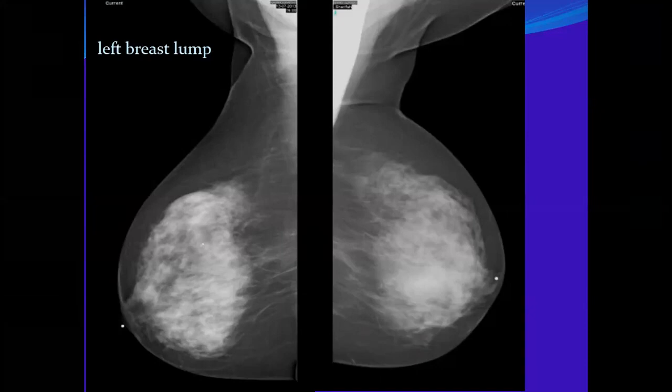I'll say there is suggestion of focal asymmetry. I'll try to correlate if it is the same location of the patient's palpable abnormality or not. Might be yes, might be not. I might say no obvious calcification, but I cannot confidently say there is none. I cannot exclude everything based on this suboptimal mammogram. Do you agree? I agree.